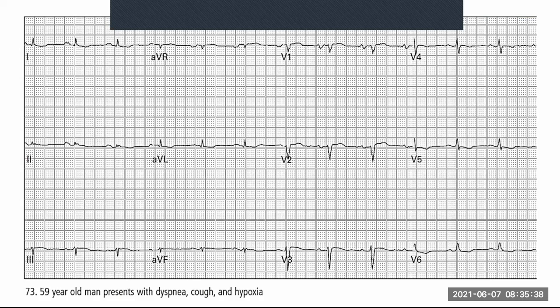Okay, right. Does a QRS follow every P? It does. So every time you've got a P wave, you do have a QRS complex, even though it's a bit widened. Are they regular? Yes, they are. Our P waves occur regularly, our QRS complexes occur regularly, even though they're not 100% normal. Okay, so we already know something's happening on that right side of the heart.